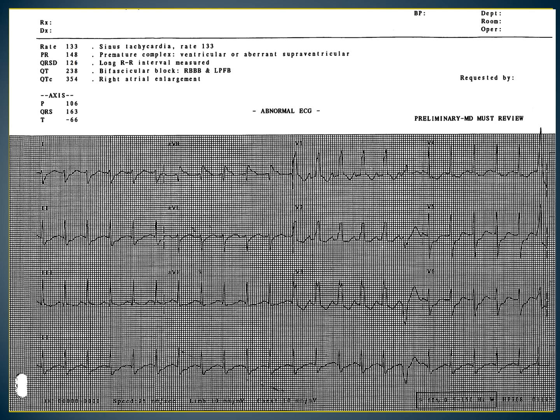So now let's look at the QRS interval. Is it too wide? Yes. It is 126 milliseconds or 0.13 seconds. Where do you go now? Go to V1. What direction are you going to shade? And what bundle branch block is present? If you said that this is a right bundle branch block, you are correct.